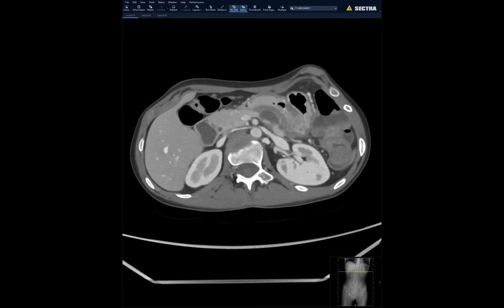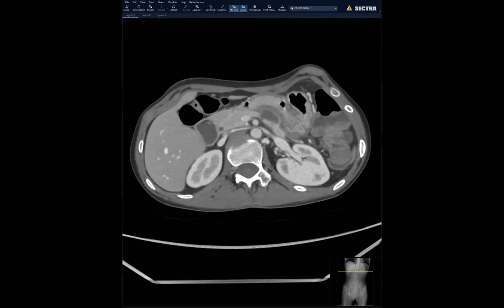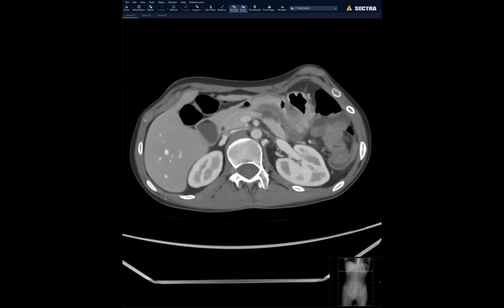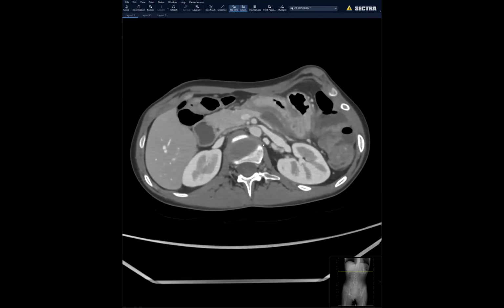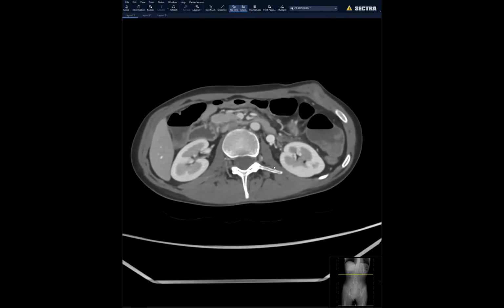And then on the sagittal, that SMA to aorta angle is very shallow. Typically, it should be, I think, 45 degrees. The lumbar veins dilated? Looks like they are, maybe. They are. Gonadal veins, yeah. So yes, the gonadal veins were dilated as a compensation or reflux, I guess.